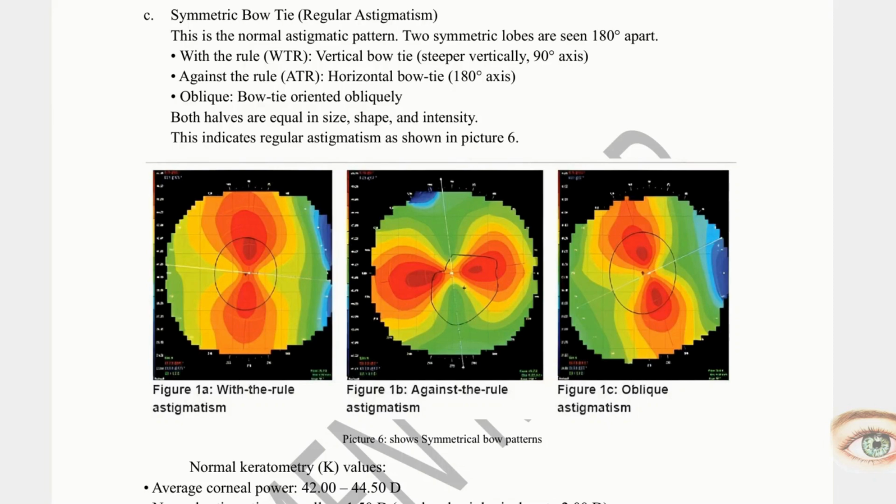A difference of 1.5 diopters is acceptable if the inferior is slightly thicker, more steep. But if the superior bow is slightly steeper, a 2.5 diopter difference can be acceptable, since it is very, very rare for ectatic disorders to develop a steeper cone in the superior portion, right? So inferior steepening is very much in the red zone, and there should not be a difference of more than 1.5 diopters when the inferior is steepening.